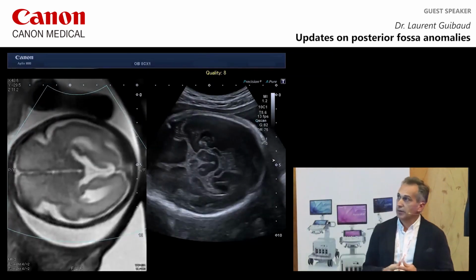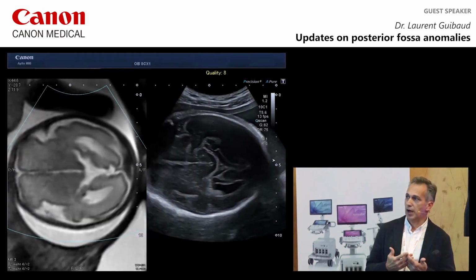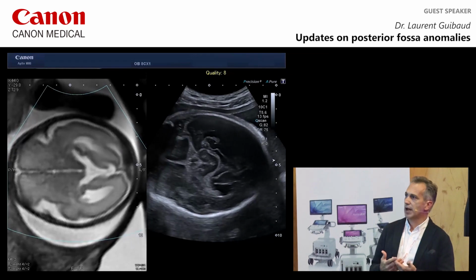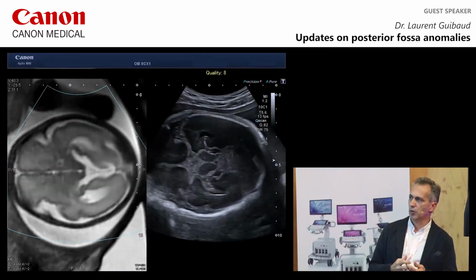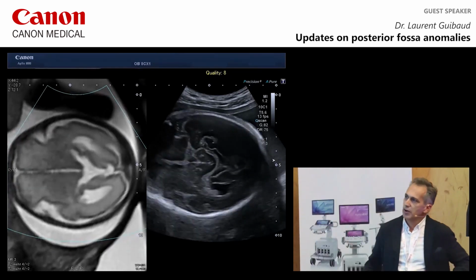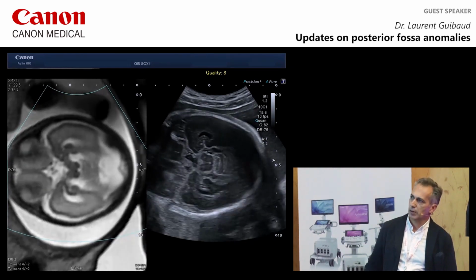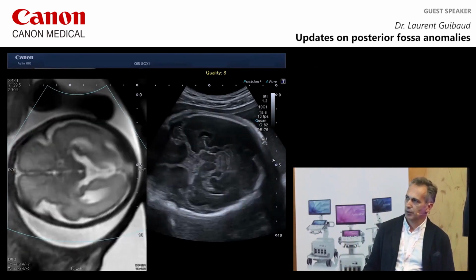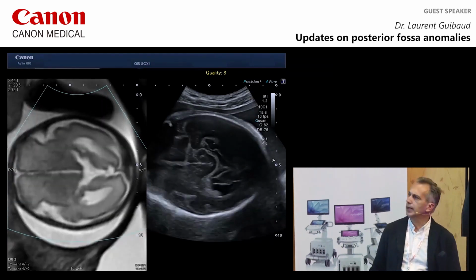So I think that it's clear for me that for academic purposes, it's very nice to do this kind of fusions between MR and ultrasound. And if I ask you what's the gestational age of these patients, and we'll speak about this later, on Monday, yes?